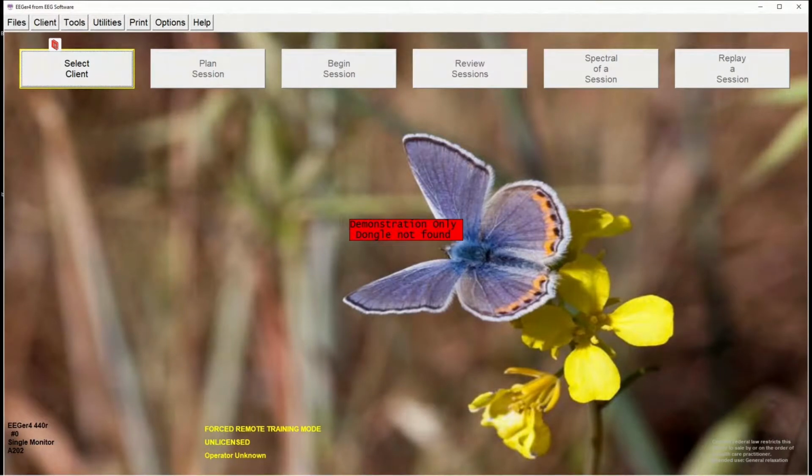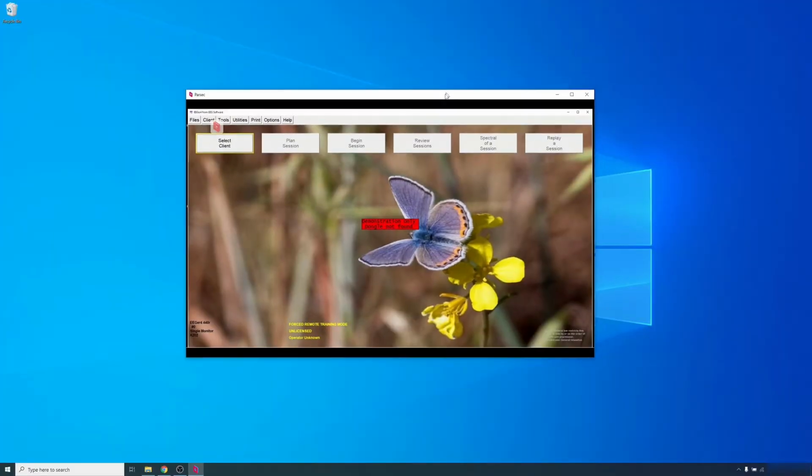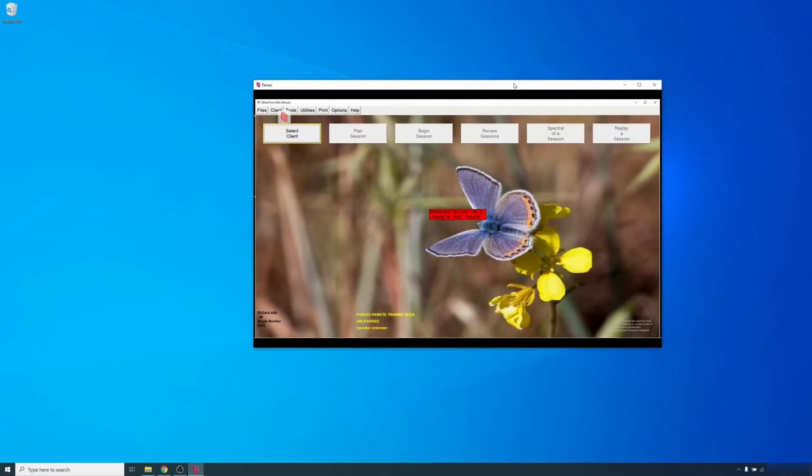It allows for the supervising clinician to do things like disconnect, change the window type, and open a text chat with the host computer. What we'll want to do is click the button labeled Windowed. This will make Parsec show up as a small window that we can drag around or maximize, just like any other program on our clinical system. Having Parsec in windowed mode makes it easier to open up other programs like a web browser or our own version of EEGer on our clinical system, and also to access our taskbar at the bottom of the screen.